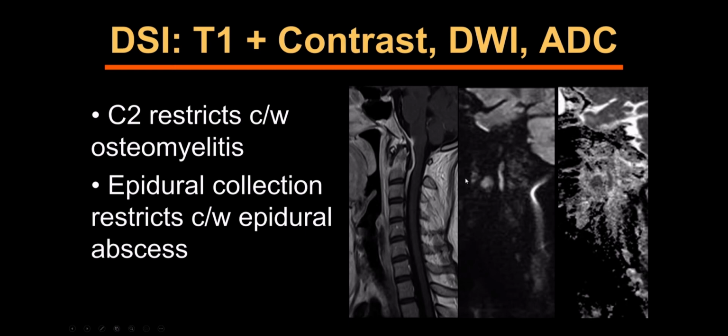Now, in this case, we also went ahead and got diffusion-weighted imaging. One of the things that we noticed is that our trainees at the University of Arizona were having a lot of trouble with these spine infections, and they basically are our first line at night. And when it's 3 in the morning, I want that first line to be intact, making good diagnoses and being pretty confident about their diagnosis.